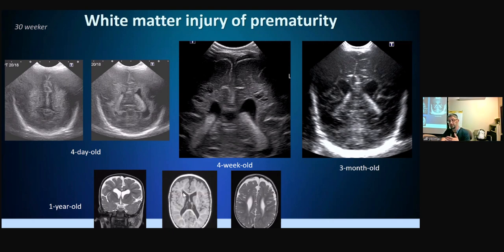So you should always be able to see the same amount of white matter posteriorly as compared to anteriorly. Anteriorly, there is this much white matter, but posteriorly you don't see it. So you lost white matter. And the most common cause in a preterm infant of losing white matter is PVL. So even if I don't give you any clinical history, when you see this MRI, the first diagnosis you should think of is PVL.